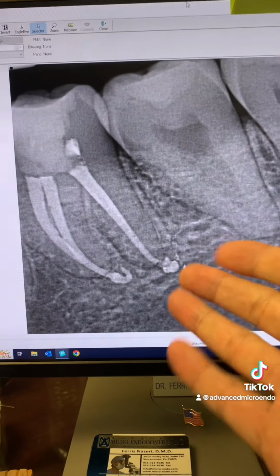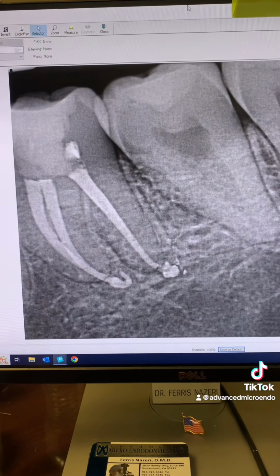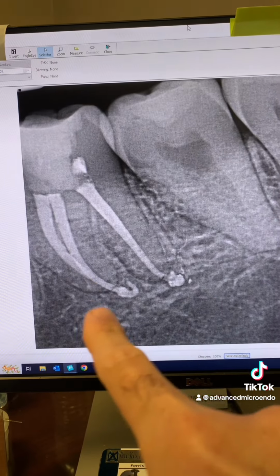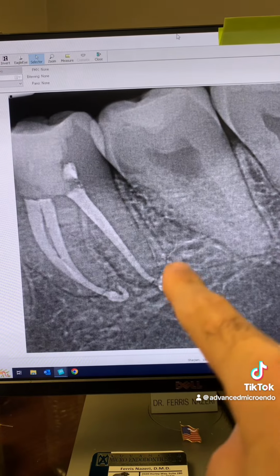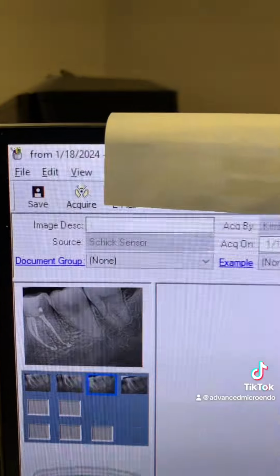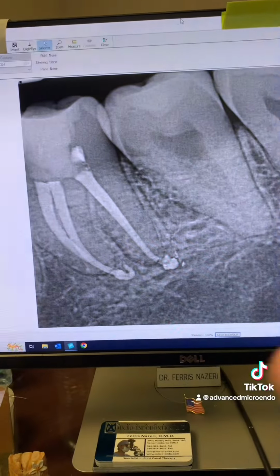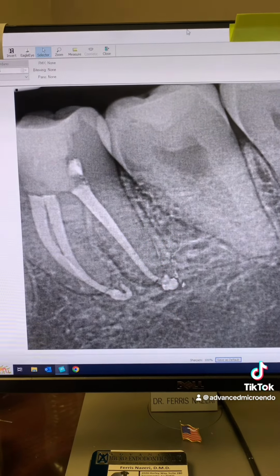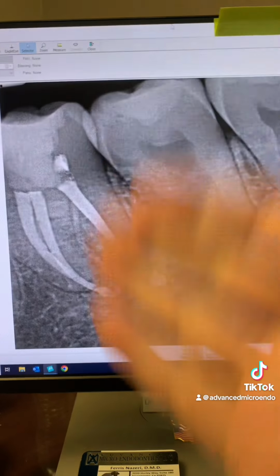And this was just now, today. The patient came in for her post-op check, and take a look. The large periapical lucency associated with the mesial roots is healed completely. The periapical lucency associated with the distal root healed completely. And here's the date. As you can see, it was today, a year and a half almost ago, when we did the root canal. So this is a year and a half post-op of tooth number 30. So one appointment endodontic treatment works.